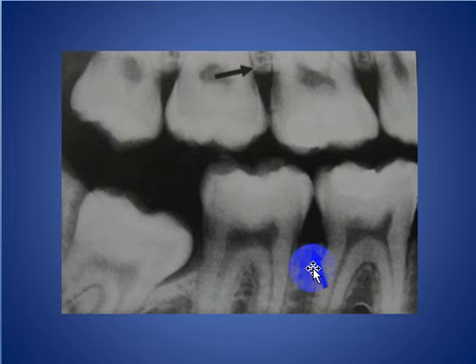And the bone between both teeth, the alveolar bone, surrounds the teeth, and its gingival margin is about 1.5 millimeter or less, and shows apical recession with age or periodontal disease, as we see here between the teeth.